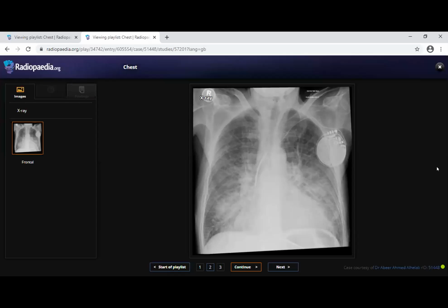Frontal chest radiograph for a mature skeletal adult patient showing mild enlarged heart shadow, prominent post-hilar shadow with upper lobe blood diversion, bilateral asymmetrical perihilar diffuse ground glass opacification, evidence of interstitial reticular thickening with short curved Kerley B lines related to the costophrenic angle on both sides, more prominent on the right side. Evidence of a uni-lead pacemaker with its tip in the normal position.